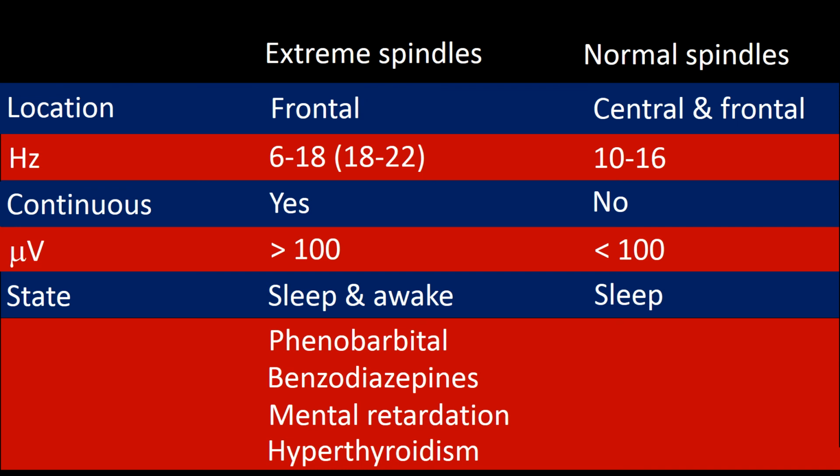Extreme spindles occur in patients taking phenobarbital and benzodiazepine. They have also been reported in patients with mental retardation and hyperthyroidism. Chloral hydrate at high doses produces excessive spindles.